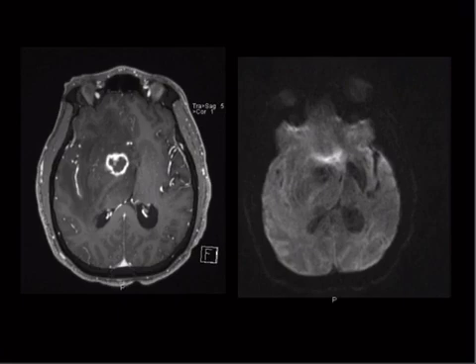So get that list together in your head. It's listed in my books. You can find one online if you don't have one right away. So this is a case where the thing is not restricting diffusion. So remember I said certain infections? So not all infections. Classically, bacterial infections restrict diffusion. Atypical infections, like this one, which is actually a case of toxo, do not restrict.